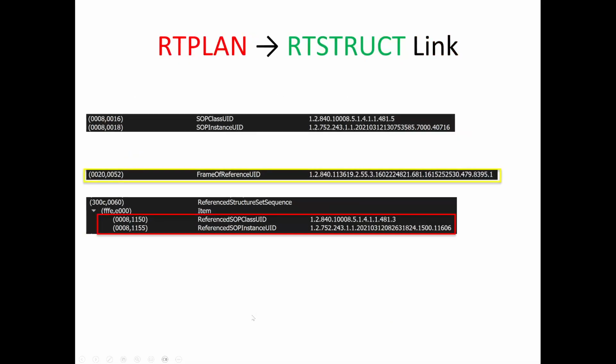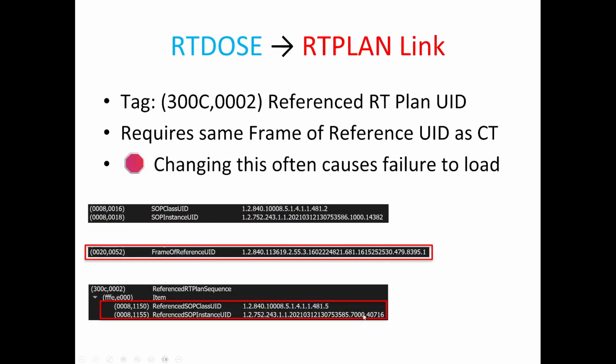We can go back to check our RTPLAN. This is the same instance UID 40716, and it's the same here referenced by the RTDOSE.